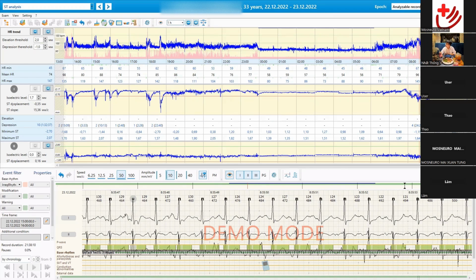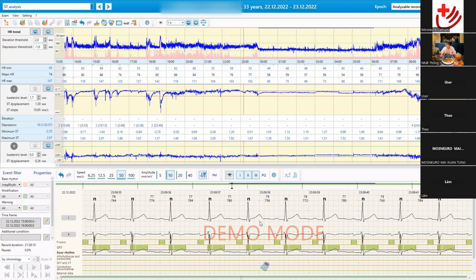So when we check from the zero line, or we check from this initial value, we can find these events.